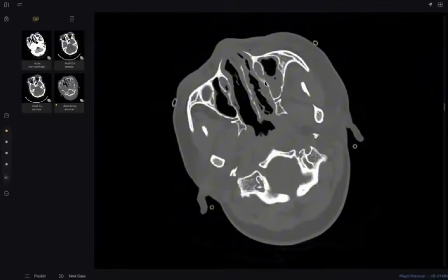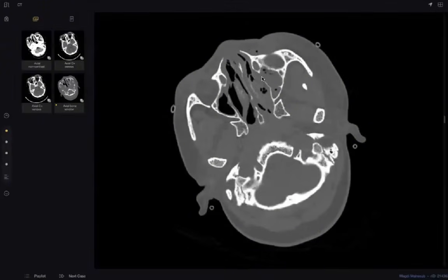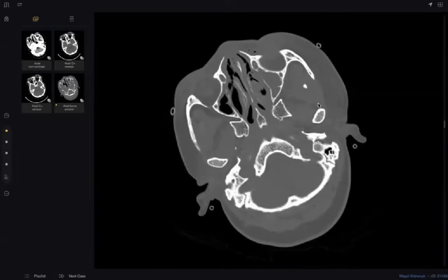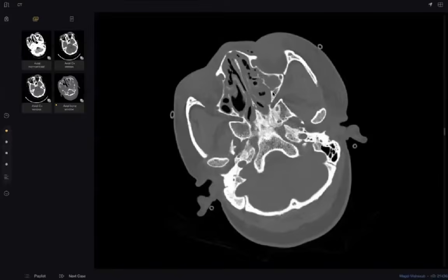Look, Dr. Naram, bone erosion, especially in the medial wall, very large. Compare with the other side. Bone erosion and rarefaction. Rarefaction means thinning out. So there is at least some evidence of fungal sinusitis here, invasive type.